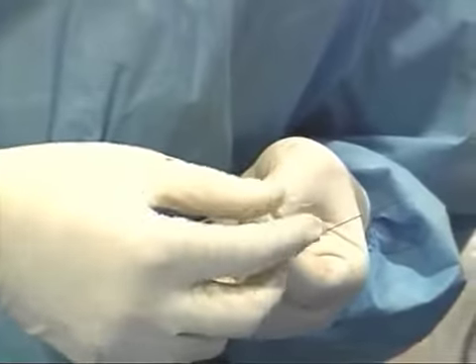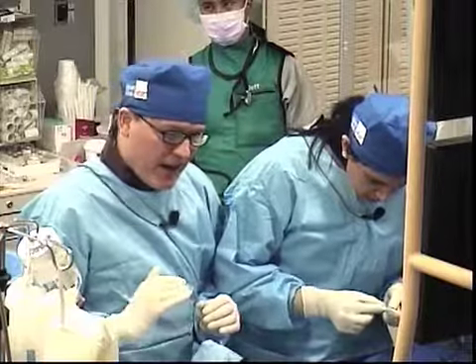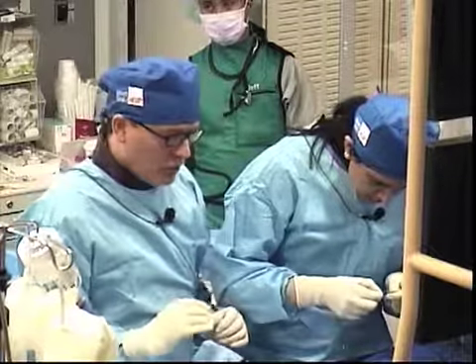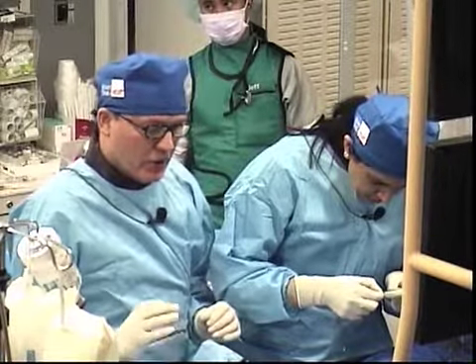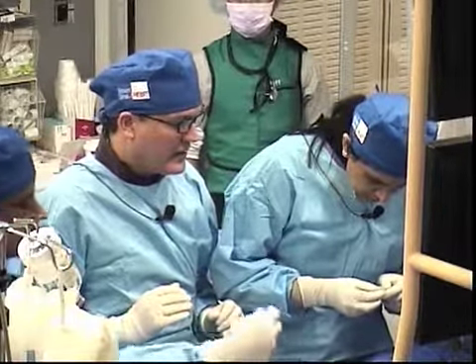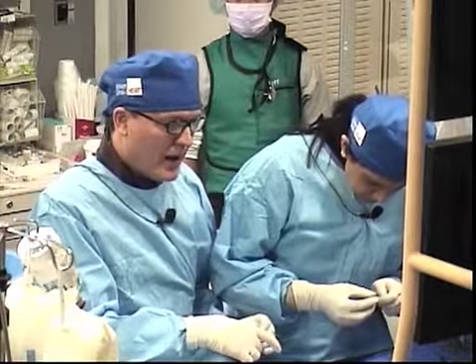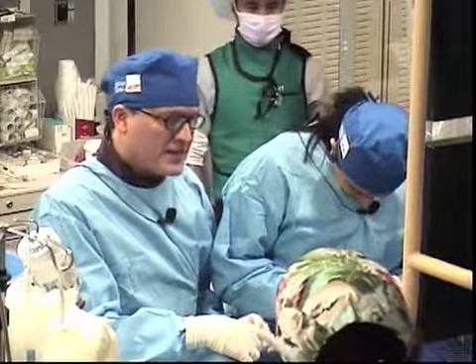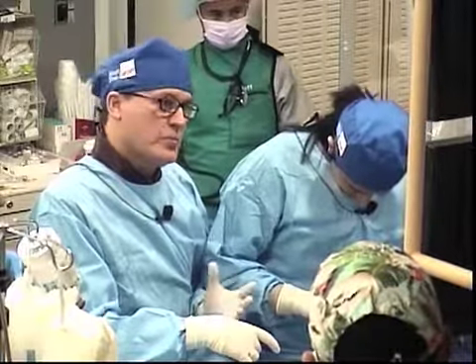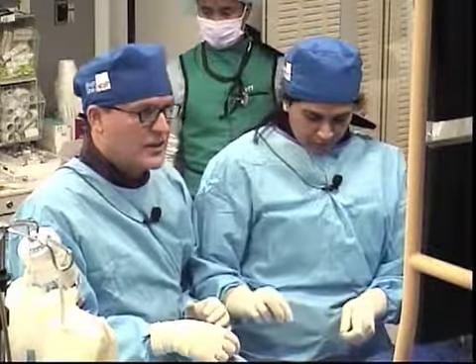There is a committee right now that has met both at the ACC and at TCT trying to develop the actual standards to interpret the images on appropriate coverage. But we believe that for chronic stents, if you have at least 1 layer of cells, you are endothelialized, and in acute stents, you just measure your acute gain, you see the stent apposition, and you see your stent expansion.